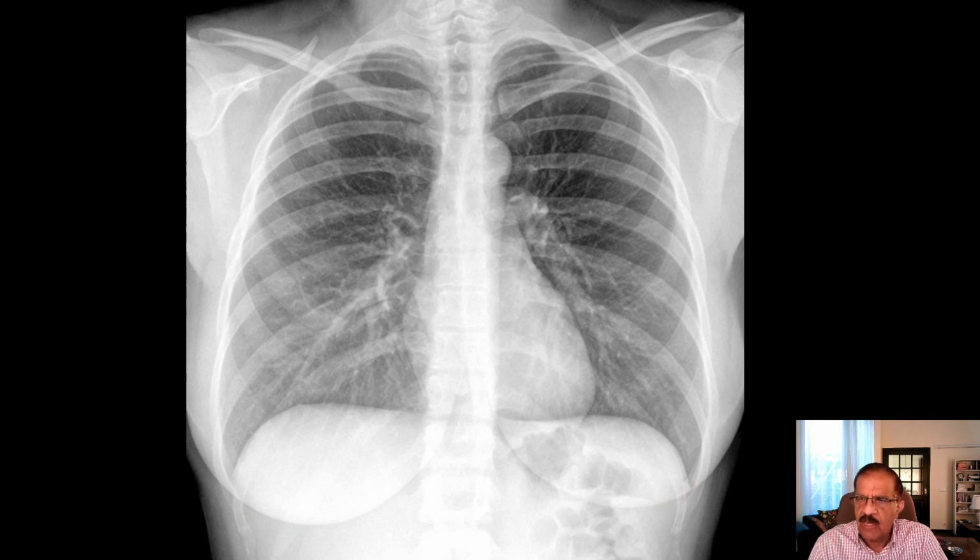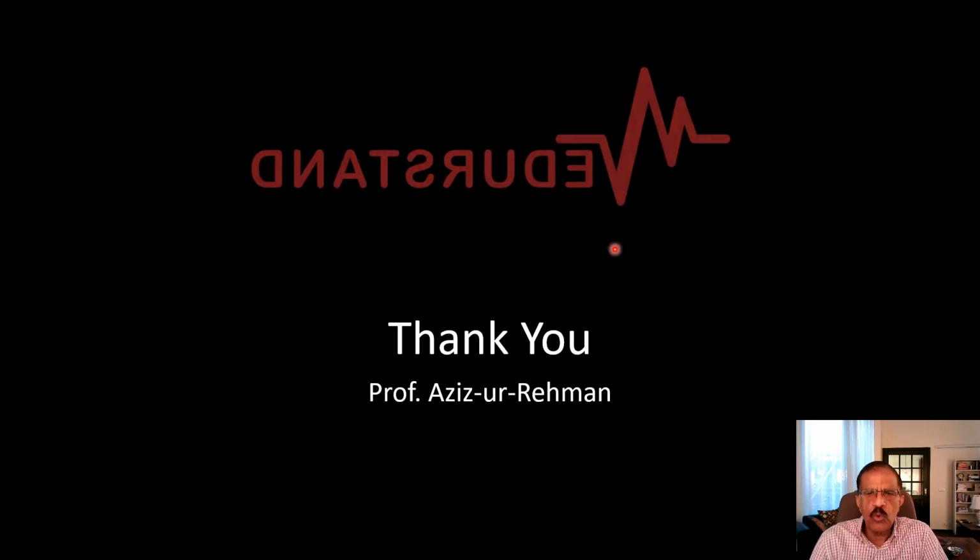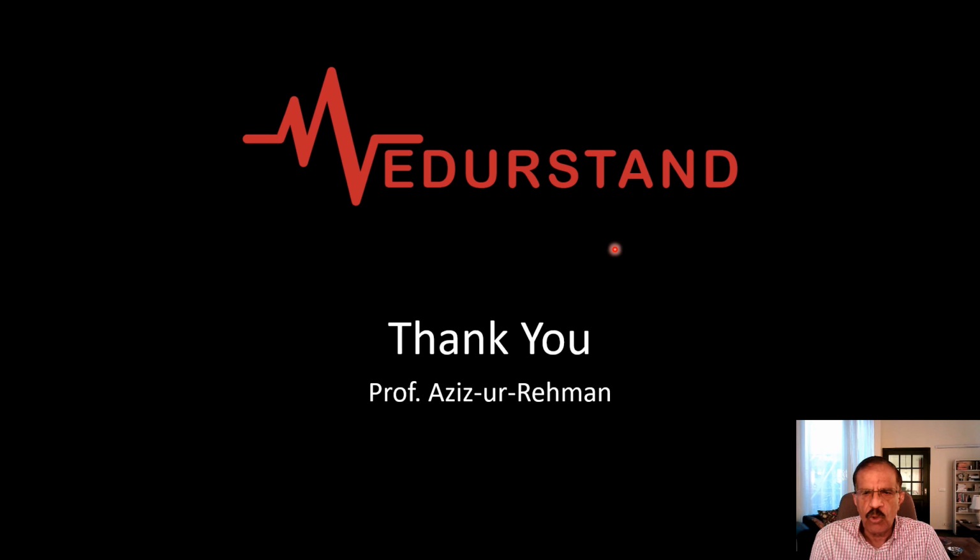So this was it, and thank you very much. I showed you multiple normal X-rays, and I just hope that you have learned what is normal. And of course, the best way to learn what is normal is to see as many normal X-rays as you can. There is a lot of variation even within the normal range, so you have to familiarize yourself with all the normalities, and then only you can pick up the abnormalities.